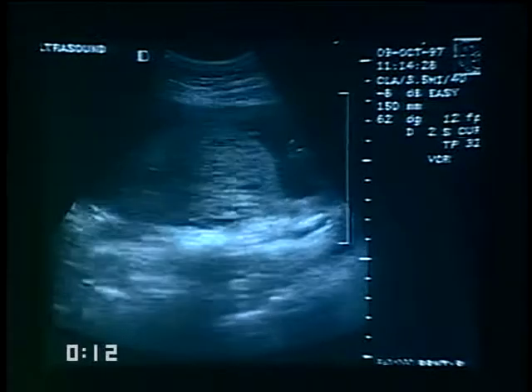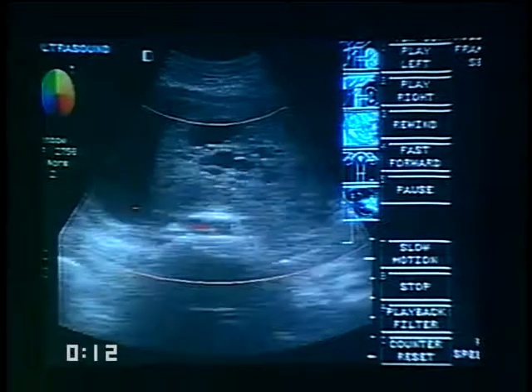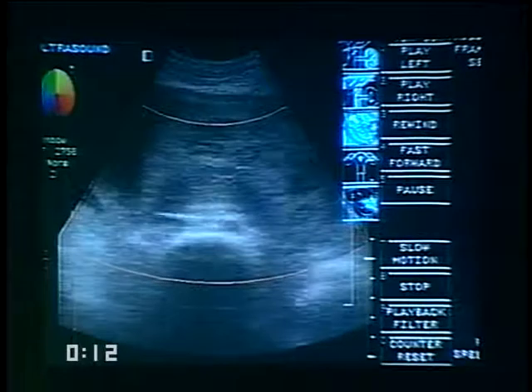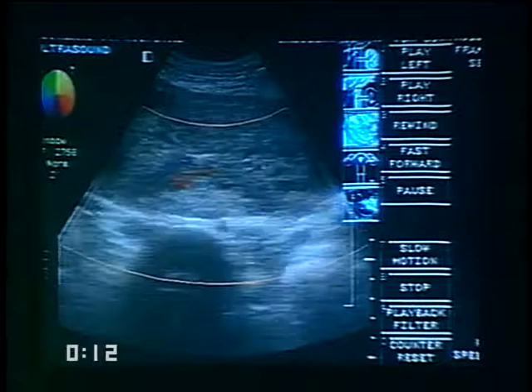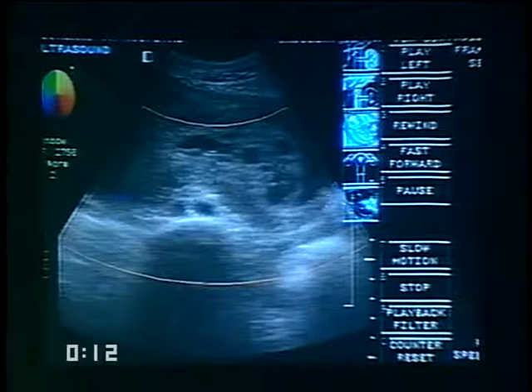We're looking at the uterus. And there's a complex mass filling the uterus. Mass is chiefly solid. It's got some cystic spaces. This is color Doppler. That's an example of a mole. It's got more cystic spaces and more cystic areas than the slide that I showed earlier. But again, it's somewhere on that continuum. It isn't quite a cluster of grapes.